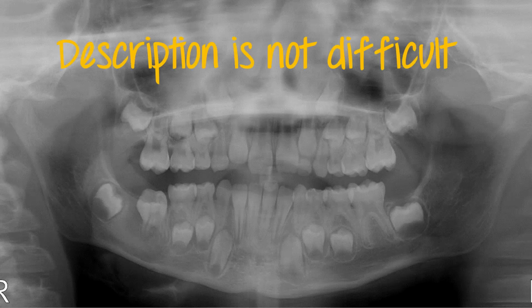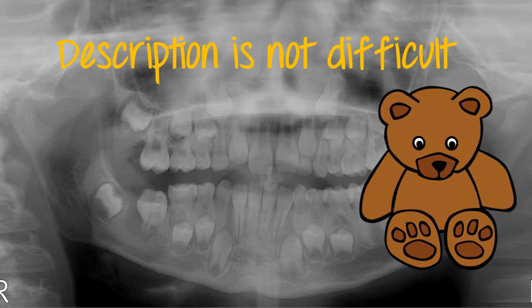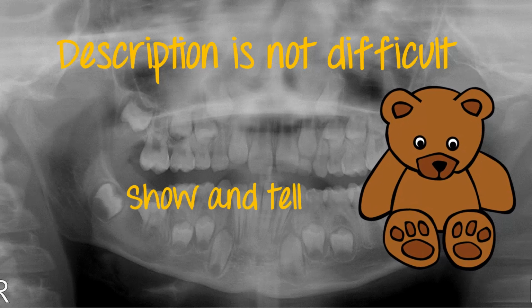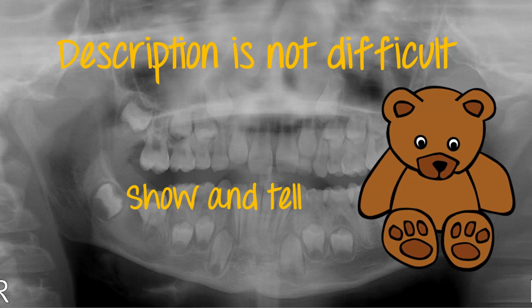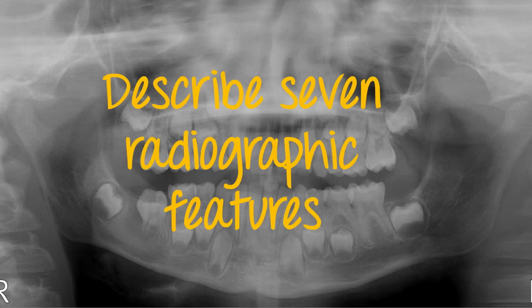Description is not difficult. Even elementary school children describe things regularly. This is show and tell. In radiology, we do the same thing, show and tell. We see features and we tell about it. Easy, easy. Just needs some practice. So how do we describe a lesion? There are 7 main radiographic features of a lesion. Just 7. Practice a few days and it will be second nature to describe a lesion quickly and thoroughly.